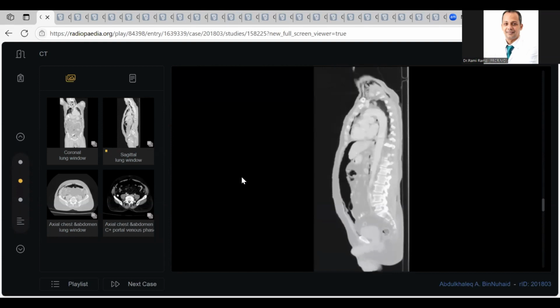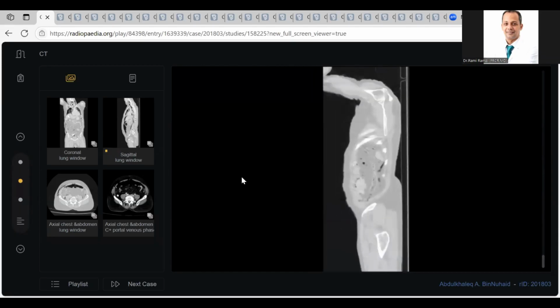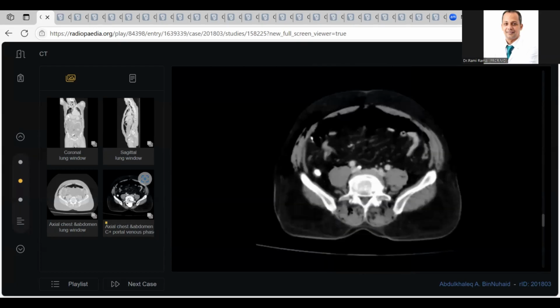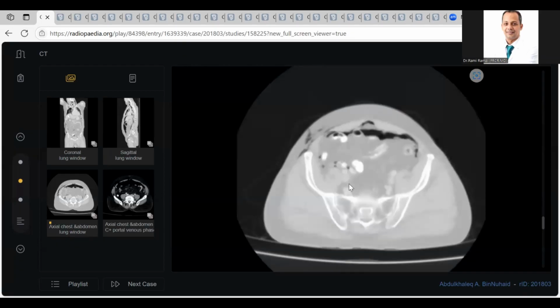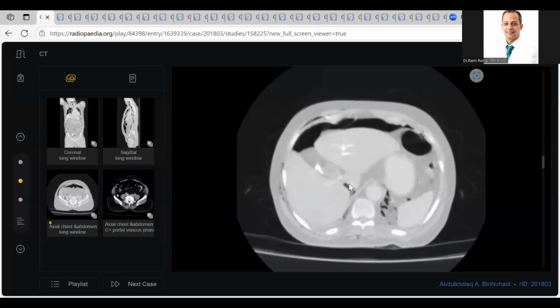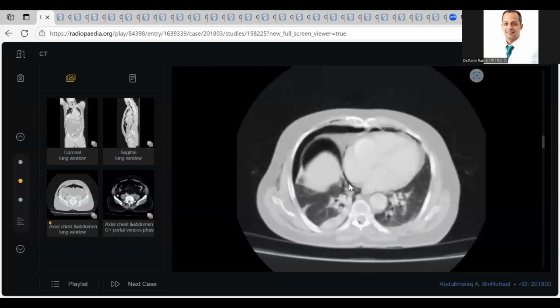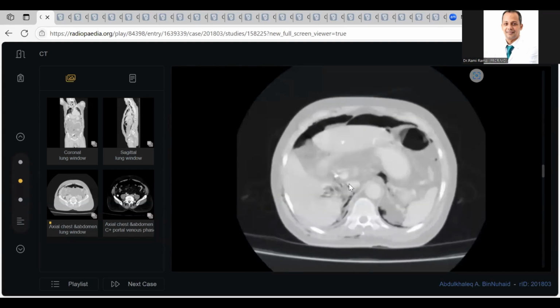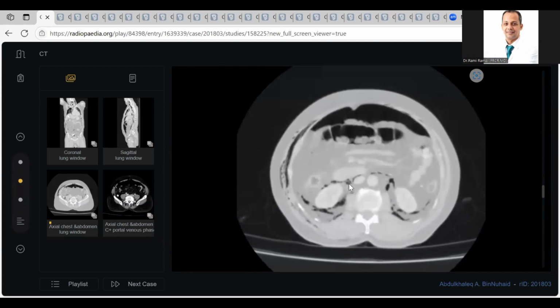He just wanted you to enumerate what you are seeing. This is not only pneumoperitoneum, but there is also pneumoretroperitoneum, because the kidney is retroperitoneal. So, doctor, after you describe, all of you, my colleagues, we should conclude. Doctor, I'm presenting a case of pneumoperitoneum, pneumoretroperitoneum, and pneumothorax, with findings consistent with ERCP. So this is a post-ERCP duodenal perforation.